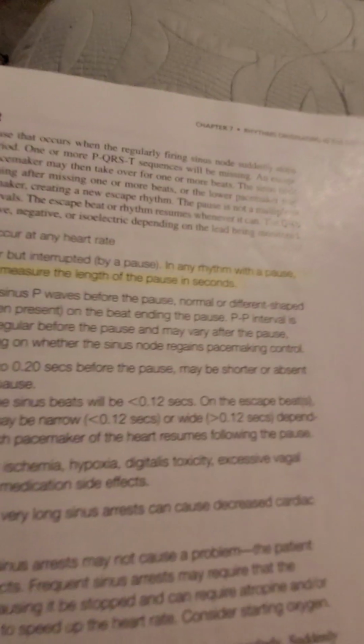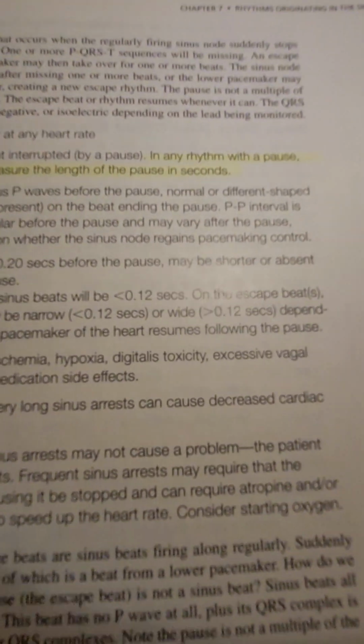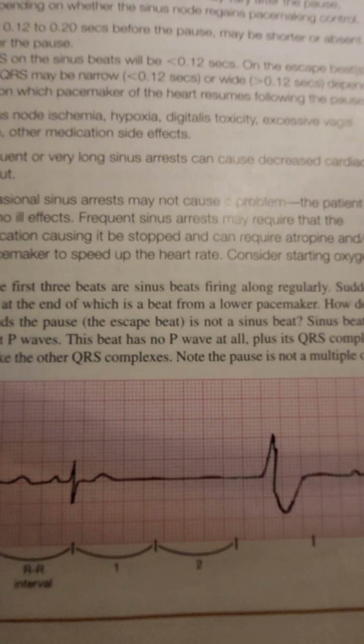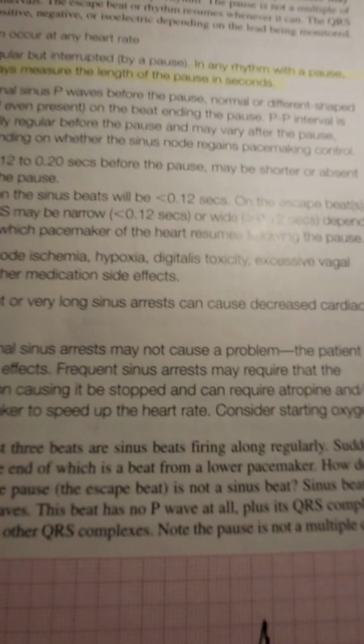But like I said, I don't really know. I just call it a pause, and then I'll tell them how long the pause was.